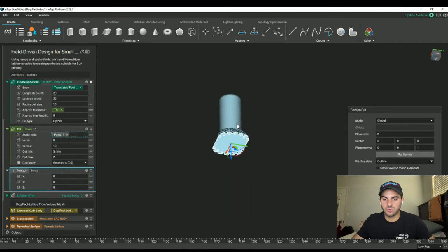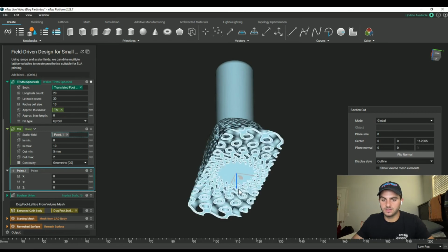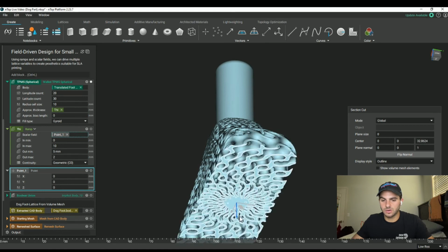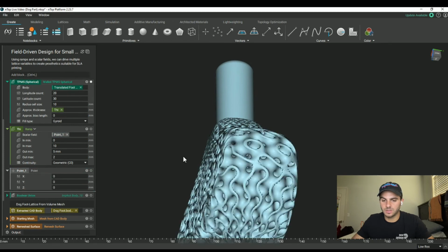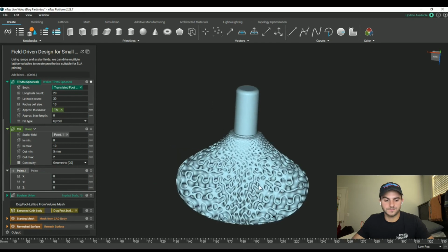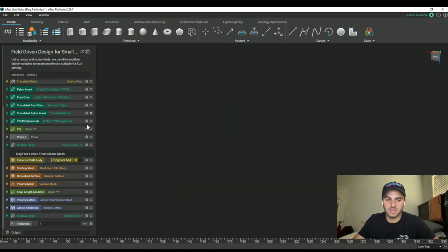Just to show how this thickness is increasing and transitioning, you can use a cross-section view to show how the thickness is changing from the middle outward. So that's really the goal for this model. We want to match the gait of a dog's foot, so we really want something that conforms to that gait cycle with this model.